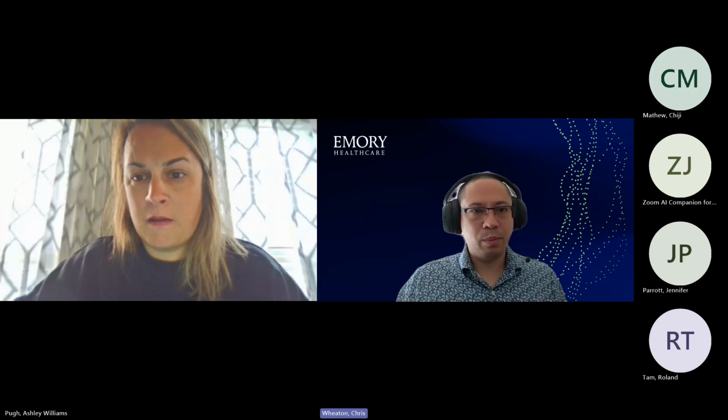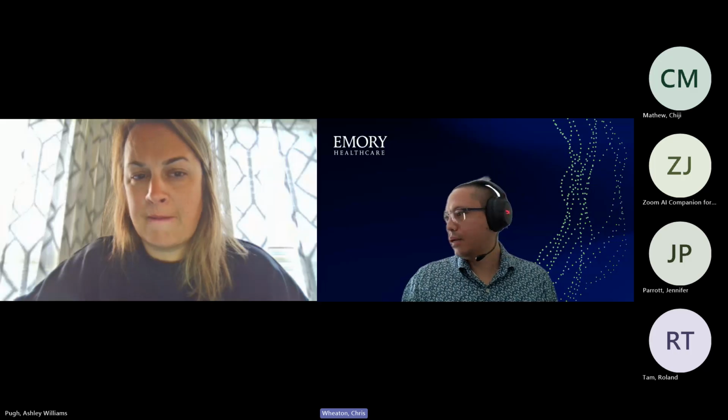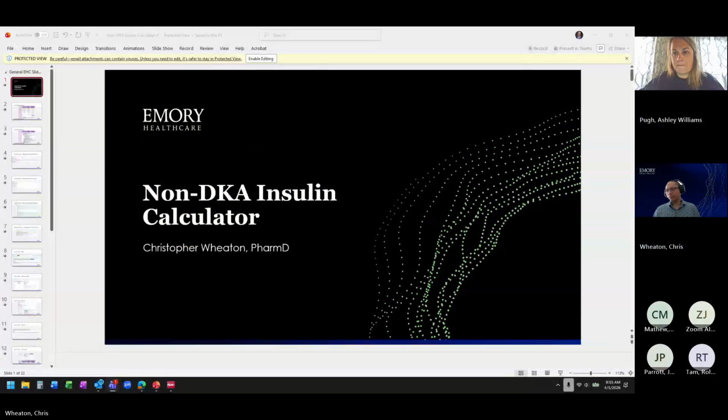Hey everyone, I'm going to go through a quick presentation and demo to go over the non-DKA calculator. So I will share screen.